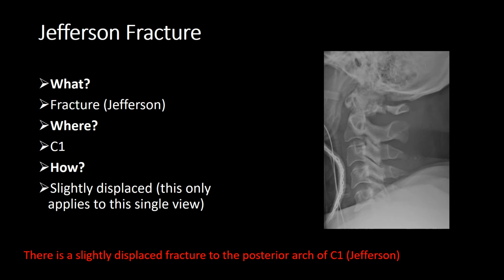What's next? B for bones. So let's have a quick look at our skull. Check the skull, back of the skull, make sure there's no fractures. Have a look at the mandible, normal. Look at the anterior tubercle of C1. Let's go around the odontoid peg, body of C2. Let's go around the entire cortex of C3, C4, C5. Let's go up the articular pillars.